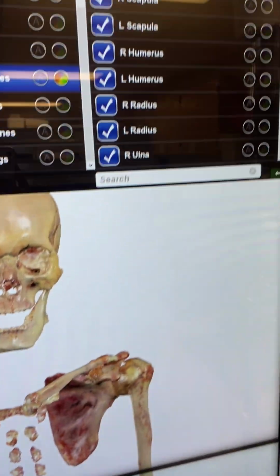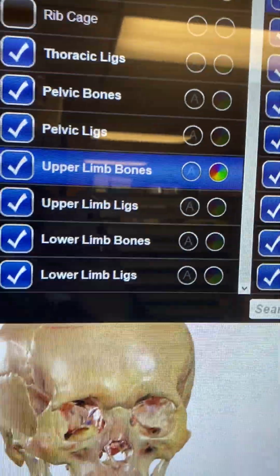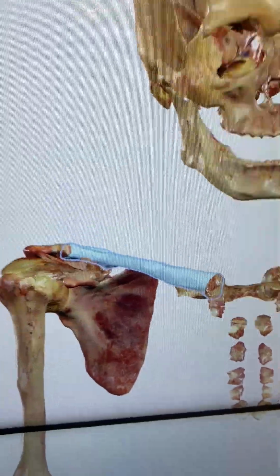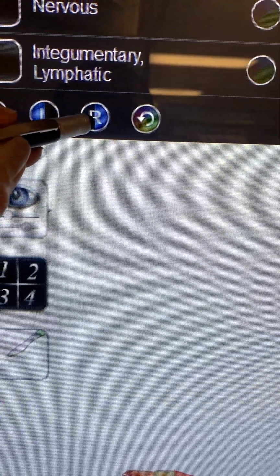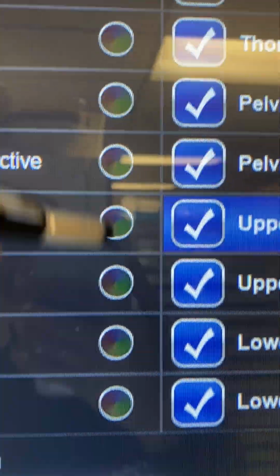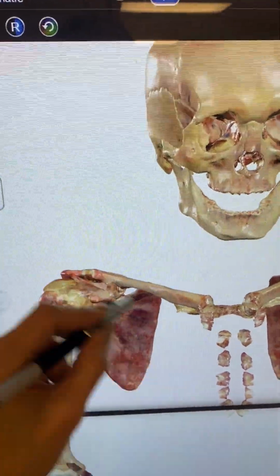Closing the window. There is another thing I want to talk about, which is annotation. But before I go to annotation, I want to tell you about this. It's easy. So this is the left. If I tap on the left, it's going to take the left up and get it back. The same will do for the right side, left and right. This is on, so because these are highlighted, if you want to undo it by tapping this one, you can undo whatever you have done.